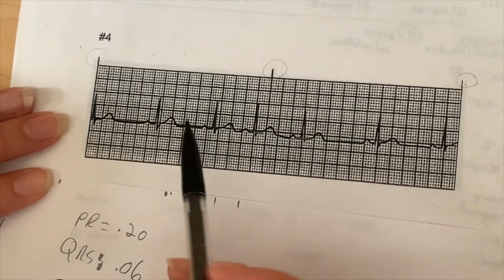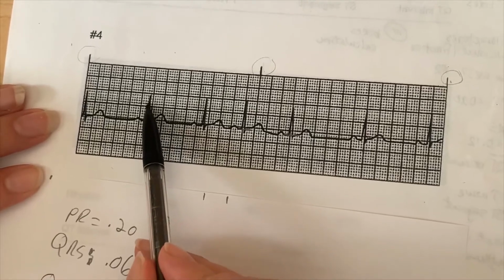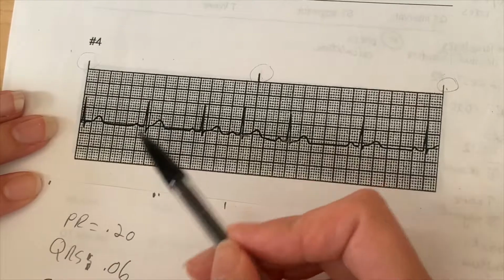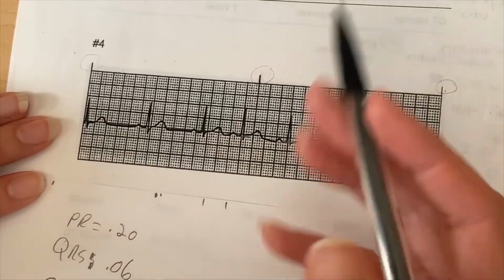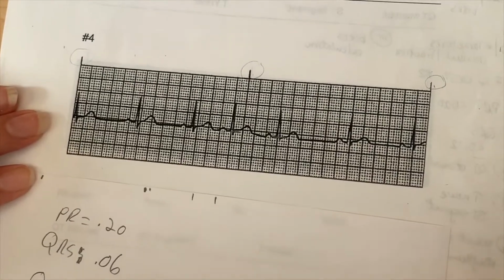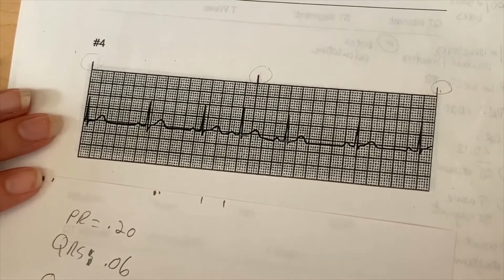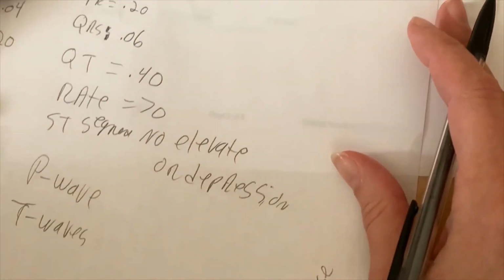And T waves is really pretty much the same. Your T wave should always be shorter than your QRS, and it should be a nice little rounded hill like this. If your T wave is inverted, meaning it's going down instead of up, that would be something to note. But mostly T waves, I know we try not to be normal, but is your T wave normal? And the answer to that question would be yes. Yes, it is. The more T waves you see, the more comfortable you become talking about having a problem. And I think that is all we have to say about measuring with paper.